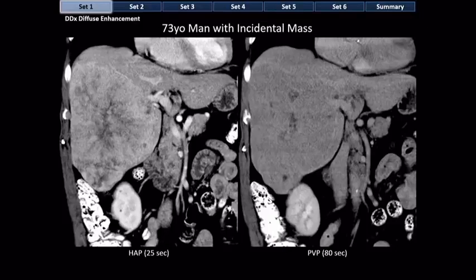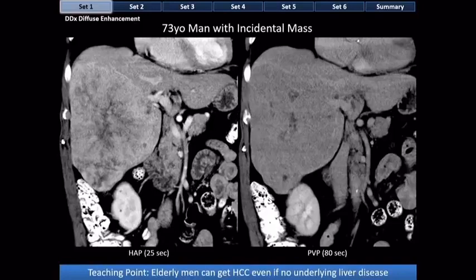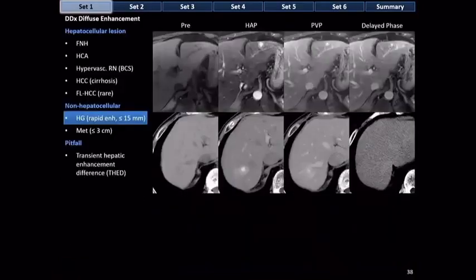And you'll see this as a radiologist. You'll probably see 5 cases like this a year. So think HCC. Now, this is not diagnostic of HCC, but think HCC. Okay, now I mentioned that some things that are not hepatocellular can also diffusely hyperenhance. So small hemangiomas can hyperenhance. These are sometimes known as flash fill hemangiomas or rapidly enhancing hemangiomas.